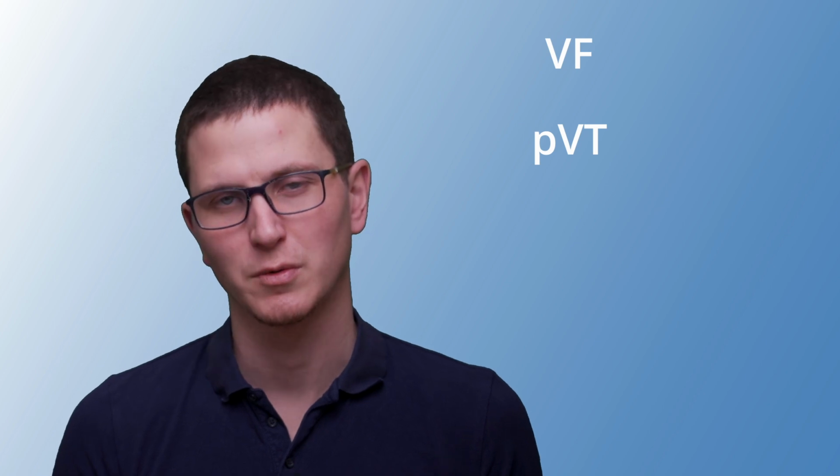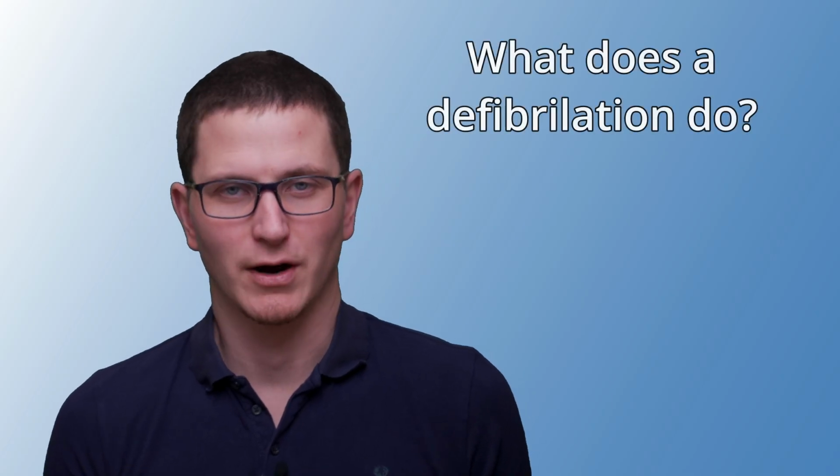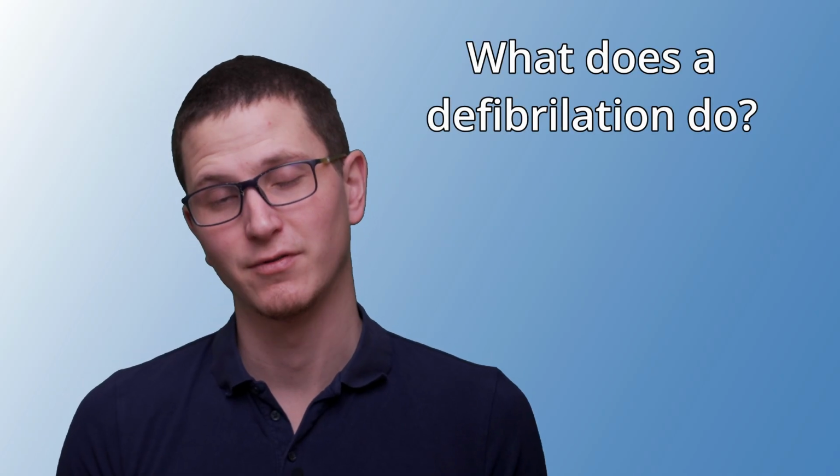Shockable rhythms are VF and VT, right? Pulseless VT. Your non-shockable rhythms are your asystole and your PEA, right? So let's break these things down. First of all, what exactly is defibrillation, right? Why do we defibrillate? What does defibrillation do?